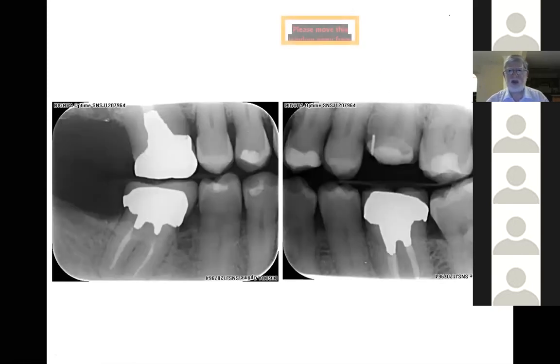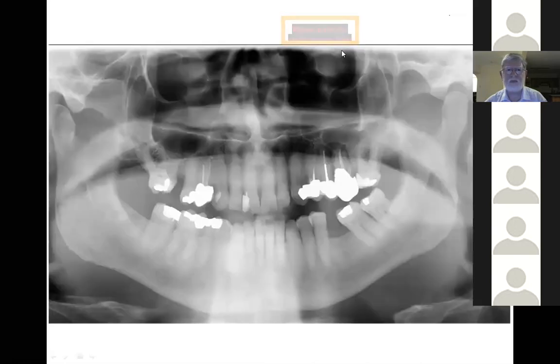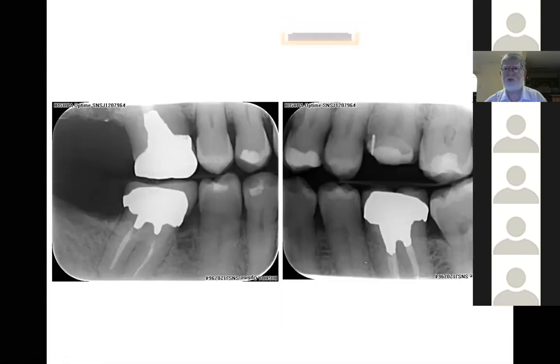I'm seeing this patient for the first time, elderly patient. They've had some endodontic work done, a broken down 26. I've taken a couple of bitewings. What further radiographic investigation would I want to do for this patient? We're getting a lot of PA and OPG.